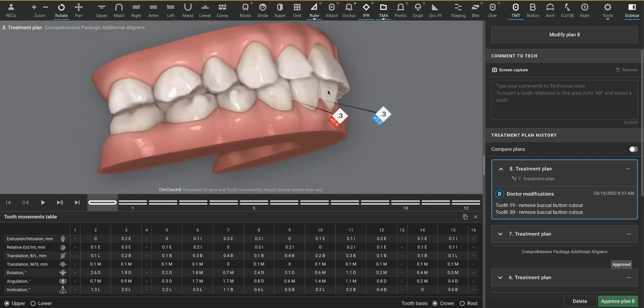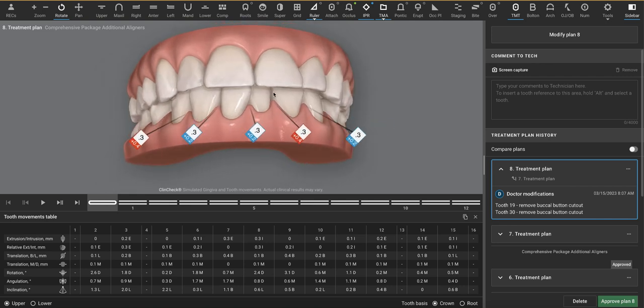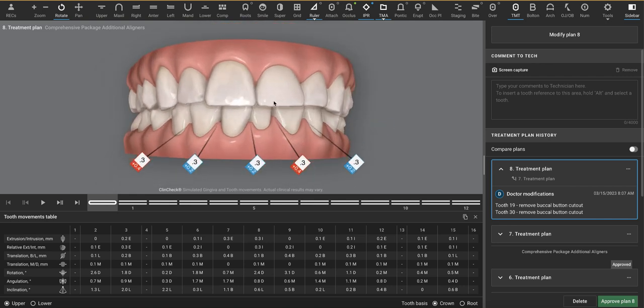So as you create good arch form down here, it's very possible that the teeth are going to interfere during closure, which might cause what appears to be a posterior open bite. That's a relative posterior open bite. In other words, the teeth are fine out back. It's not that they're not touching, it's the fact that the front teeth are touching too soon. We will resolve that, educate the patient on the fact that she might have a posterior open bite until we get the IPR between 24 and 25.